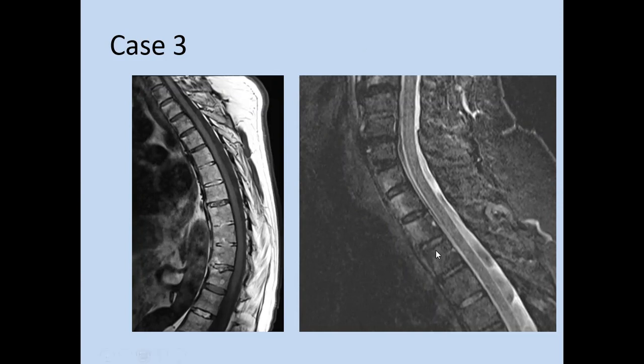Yeah, very good. So I'm just checking here to see if anyone is asking any questions. Yeah, so as you said, there is the Romanus lesion here on the sagittal T2 fat saturated sequence, the edema, and again we see the bony attachment of the anterior longitudinal ligament.